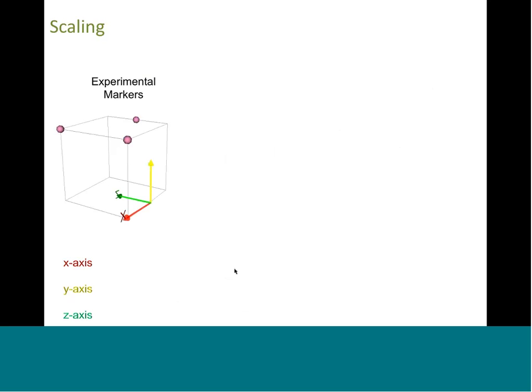When deciding how many scale factors you want to use to scale a rigid body, whether you're using 1, 2, or 3 along each of the axes, you want to think about how much information you have along each axis, and you want to use marker pairs that are on or parallel to the axis of interest on the body. For example, with the pelvis, it's not hard to get information along all three axes, but for the femur, we rarely apply markers that will help us define a scale factor along the x-axis, or the axis that points from the back to the front of the knee. But back to our example.